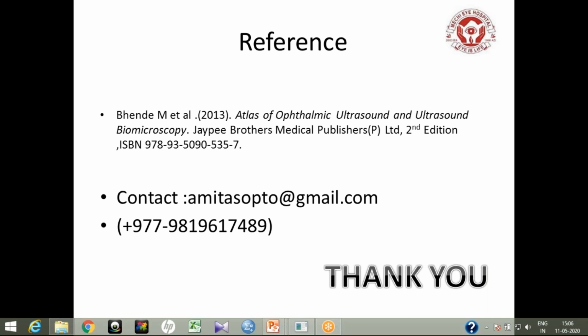But if you are very expert, then you can do it, very gently, because sometimes by pressing a bit, aqueous or vitreous comes out. So if you are not very sure, then do not do the B scan in case of OGI. You can do it after the repair.